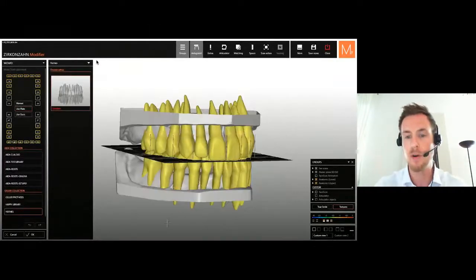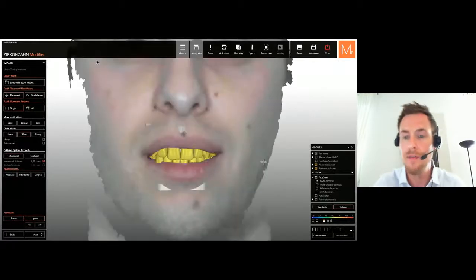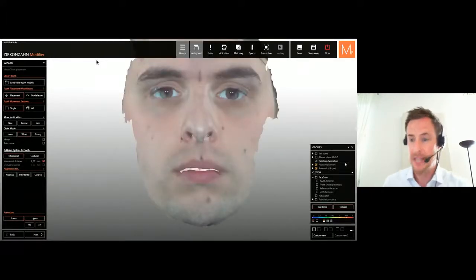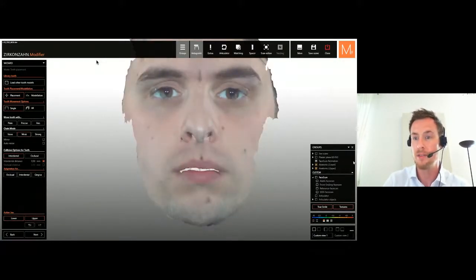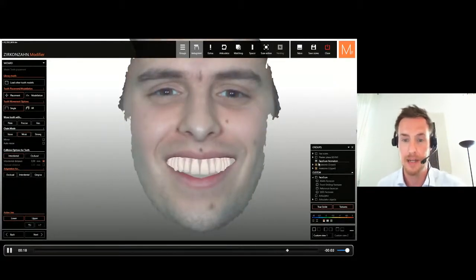Obviously, I can make any kind of modifications afterwards. I can use my facial scans to make some modifications, as you can see here in the video. I have direct feedback on how the patient can look. I can work them into the patient's mouth. And what is amazing as well, because till now we just had 3D facial scans, but only static facial scans. With a new algorithm in the modifier software, we are able to program a facial scan animation between two or more facial scans.